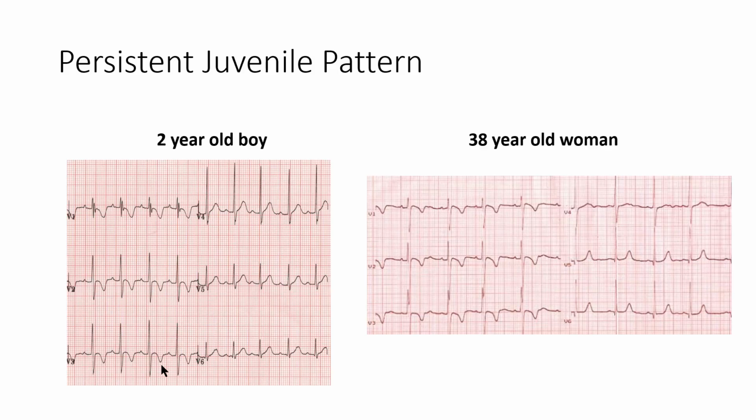So this is normal in pediatric patients, and it has to do with how their electrical axis changes over time with development. Sometimes this pattern will persist into a patient's 30s. With that in mind, it's important to recognize that in these populations, T-wave inversions are probably not a big deal and probably represent a normal variant. However, deep anterior T-wave inversion in the elderly population with cardiac risk factors is a big deal.